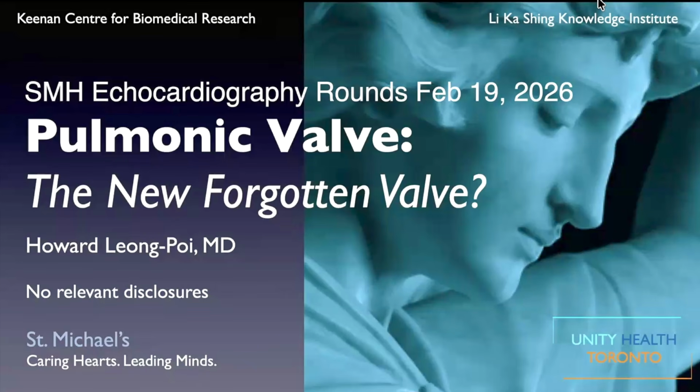It used to be the tricuspid valve was the forgotten valve, but the tricuspid valve is getting lots of attention. You've seen a number of rounds on the tricuspid valve presented here. So today I thought I'd talk about the pulmonic valve. And in all honesty, in a busy echo lab, as we're reading multiple studies on a regular basis, it's pretty easy to forget the pulmonic valve. Sometimes we fly by it, and it's worthwhile paying attention because you'll miss things occasionally.